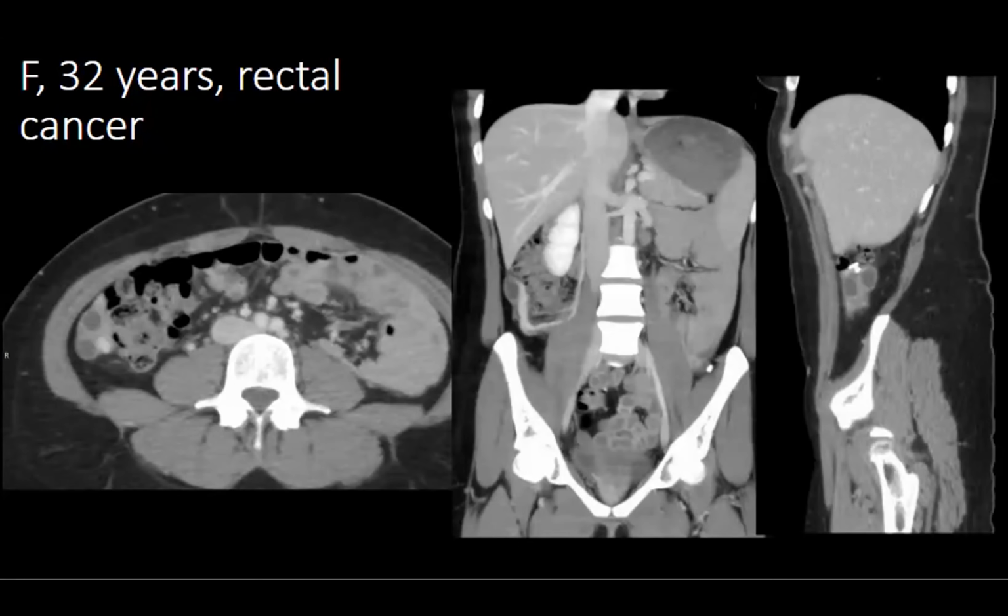So this was a young female with rectal cancer, and it was treated by radiotherapy. So both the ovaries were transpositioned, as Dr. Jambhekar mentioned. So that's the ovary, a multicystic structure, but we see the gonadal vessels going through, and we see the surgical clip.